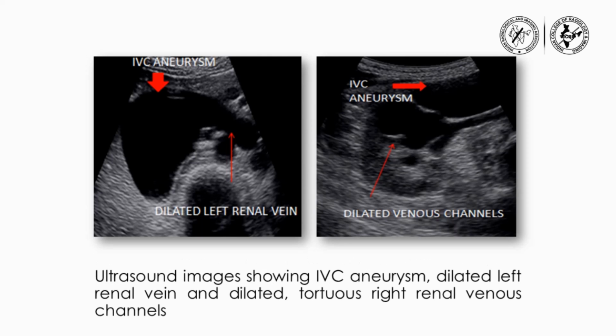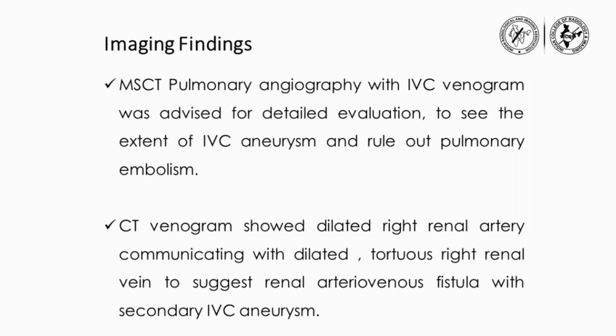As we see in these ultrasound images, there is large IVC aneurysm, dilated left renal vein, and dilated tortuous right renal venous channels. MSCT pulmonary angiography with IVC venogram was advised for detailed evaluation to see the extent of IVC aneurysm and to rule out pulmonary embolism.